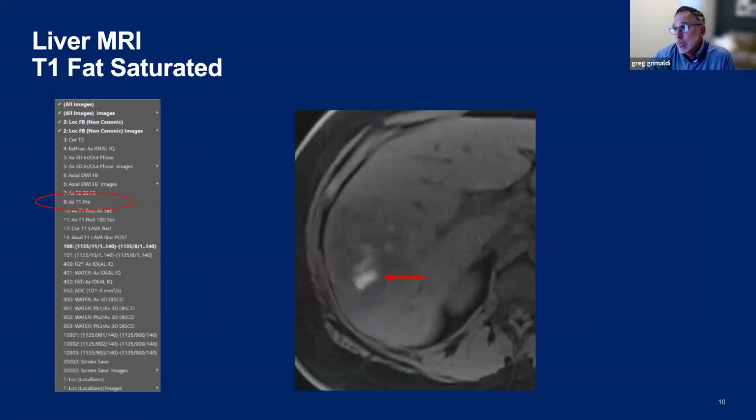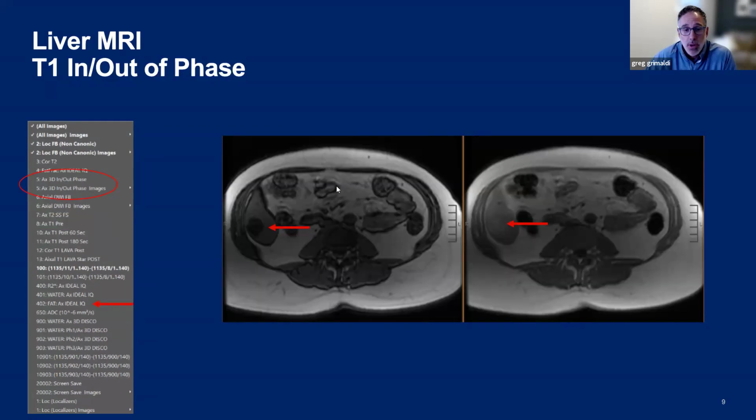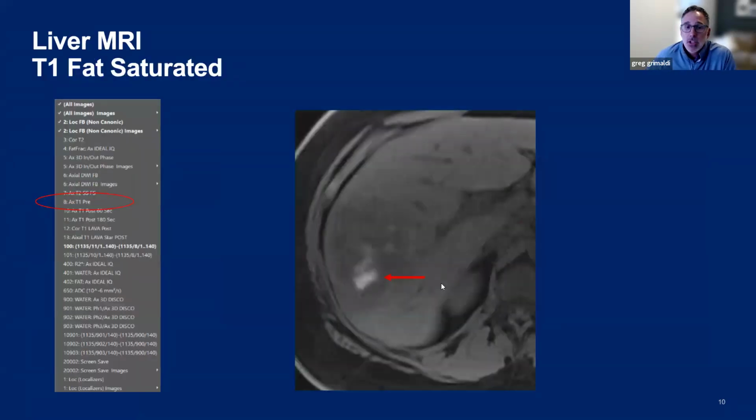Now, another type of T1 weighted image we do is a T1 fat sat. So T1 pre, usually when we say pre is pre-contrast. And what we did in this sequence, as opposed to this MR before where the fat is bright, because typically fat is bright at MRI at T1, we can actually saturate out that fat. And we use fat saturated T1 when we do pre and post contrast imaging, because it helps bring out and make lesions that enhance stand out from the background.